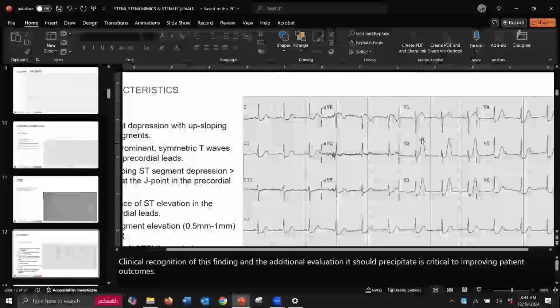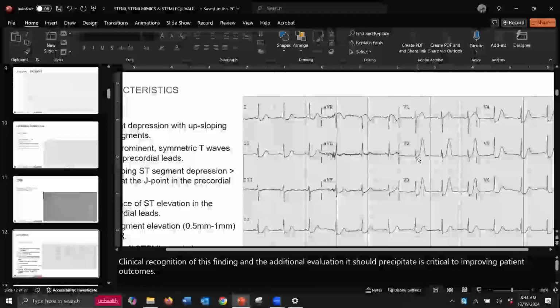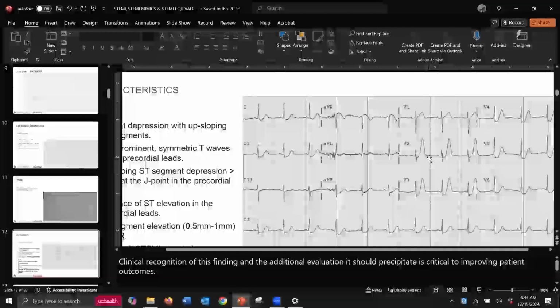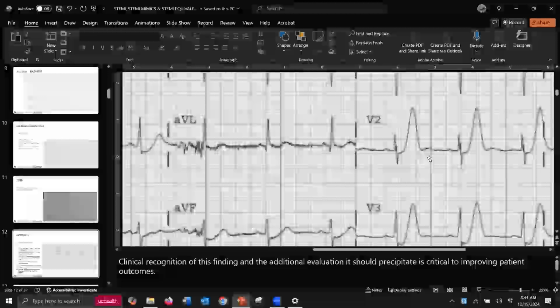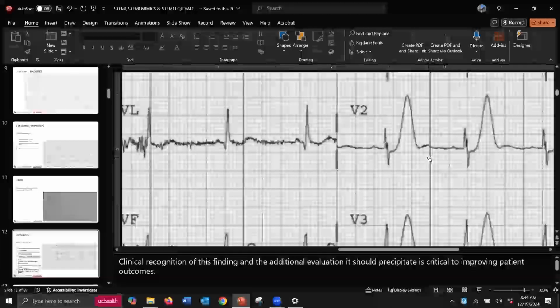If we look at this, the top of the T wave is more broad, and the base of the T wave is more broad. A hyperkalemic T wave meets the criteria of the base being narrow, which is what makes it tented at the top. So this is a broadened T wave at the base, at the isoelectric line. Let me see if I can zoom in even more without screwing something up. Is there a box standard for that though? There is not. You can't just count it out.